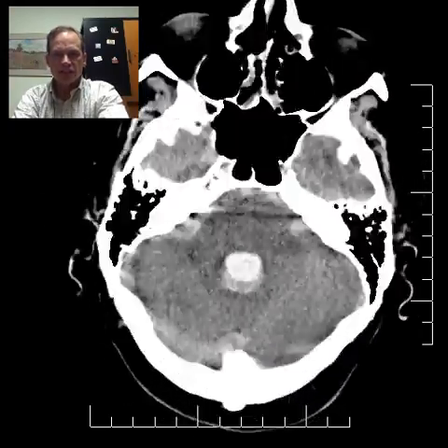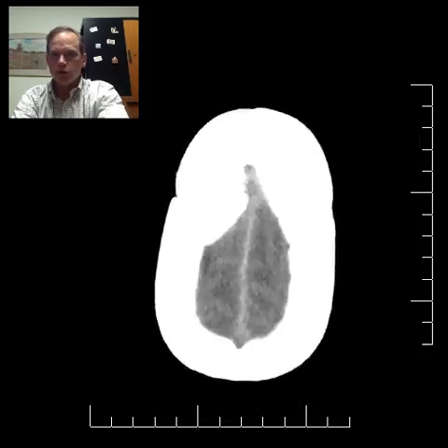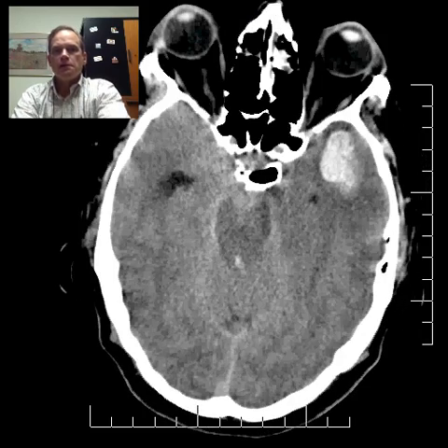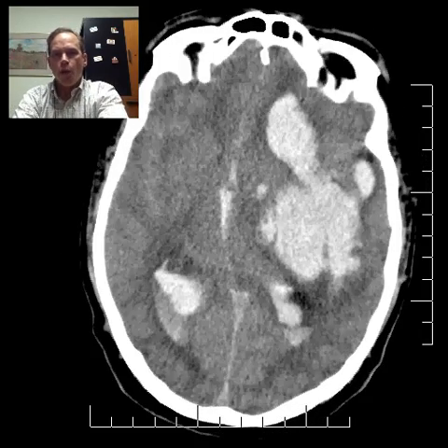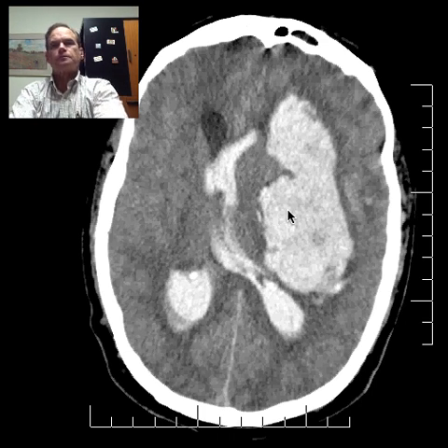A little dizzying, isn't it? Well, that's a quick overview of the entire case. We can slow it down a bit now. Okay. My goodness, where to begin? Well, I'll tell you where to begin. Right here.